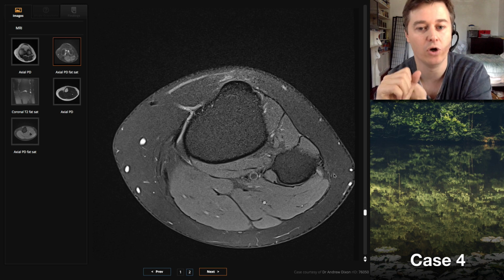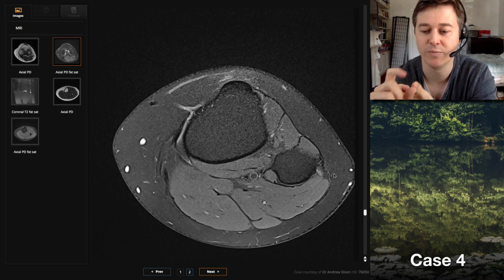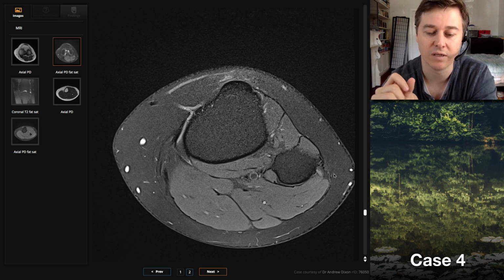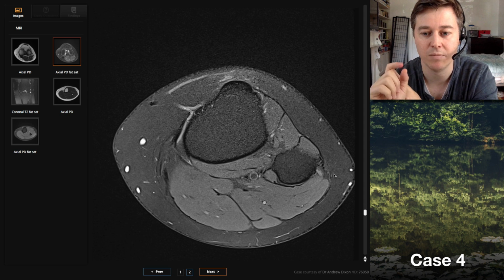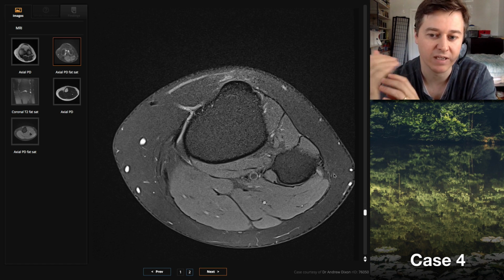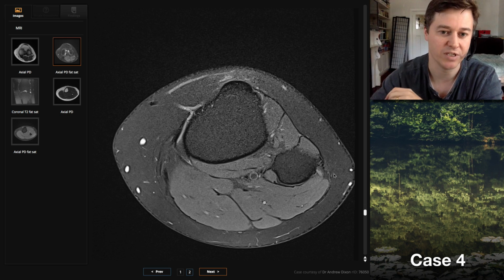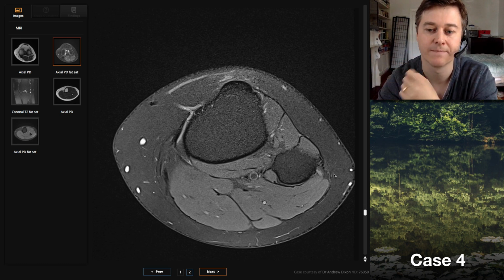But I liked what you said. You're looking first for an intrinsic lesion of the nerve. So is there any expansion of it with a nerve sheath tumor? You're looking for any extrinsic effects on the nerve. So in this area, what particularly would you look for as an extrinsic cause for impingement of the nerve? Like a ganglion? Yeah, so a ganglion coming out of the proximal tibiofibular joint often gets in the common peroneal nerve and follows it up or down. So looking for that. And what else as an extrinsic cause?